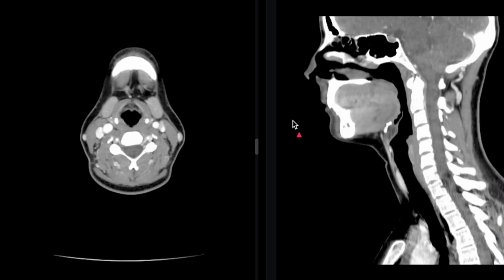One last time, I'd like to show the carotid artery bifurcation in an additional view, and this is going to be the axial view, which I have on the screen on the left. I'm using a different program to show this, just because I think it shows up better in these images. But this program, unfortunately, doesn't have a tracker line that you can orient yourself to where this axial view is, but I'll go ahead and try to draw one of my own here on the sagittal on the right.